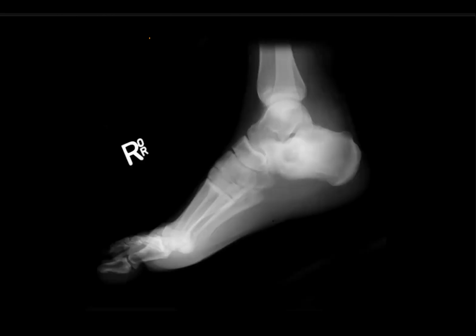Okay. What about this case? This is the lateral foot radiograph of an adult patient showing a lucent area within the calcaneus with surrounding sclerosis, and the lesion is ill-defined. There is a wide zone of transition. However, I can also appreciate some periosteal reaction on all sides surrounding it. The surrounding bones show some diffuse osteopenia. There is, however, no fracture line seen, which I would like to confirm on any other view.